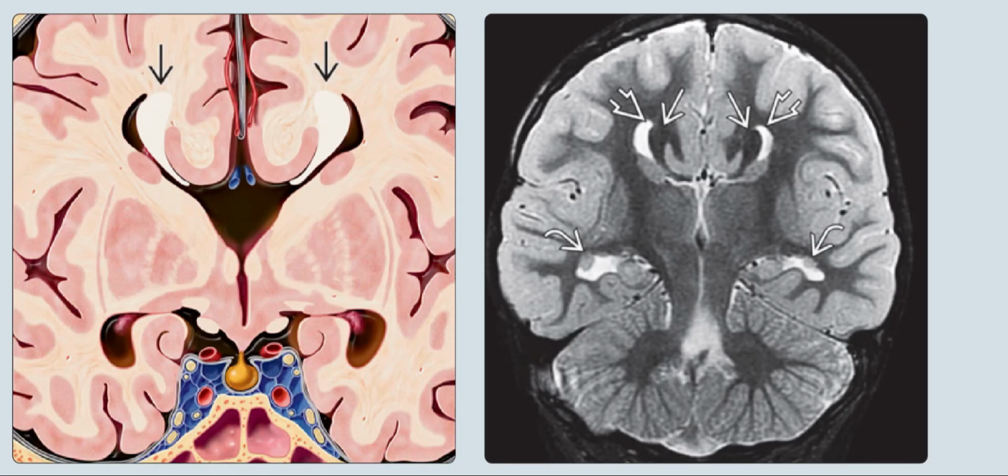Now these are again images from the coronal graphic. The image on the left is the coronal graphic and shows a lack of transverse corpus callosum and separate lateral ventricles. The interhemispheric fissure extends to the third ventricle. The bundles of Probst contain the parasagittally rerouted callosal fibers.